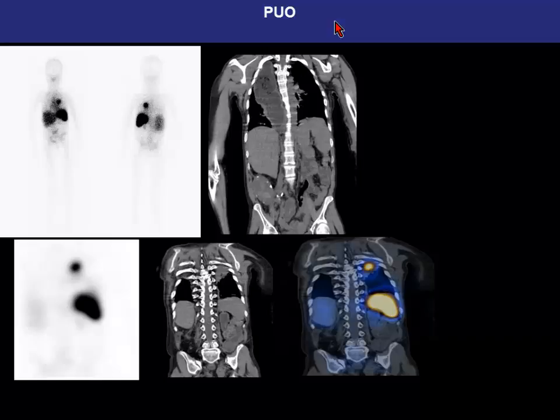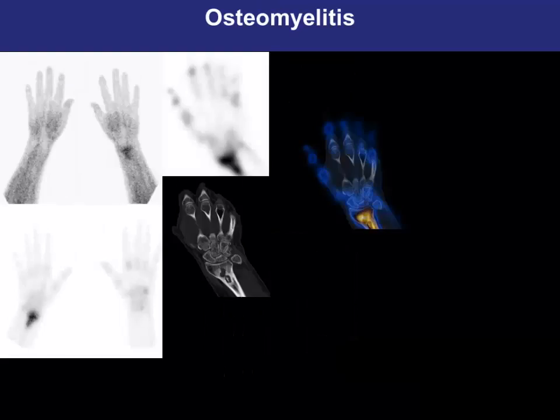What has happened in this patient is, because of the gastric pull-up surgery, the patient must be aspirating quite a lot, and that is the cause for the infection. So we excluded renal infection, and a definite source of infection was found on the planar, and we could localize exactly to the lung on the SPECT-CT.